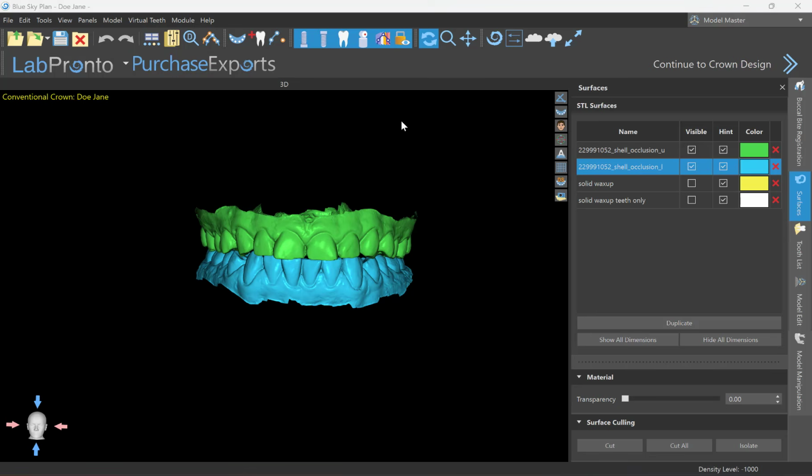Hey, this is Dr. Corey Glenn. I'm going to do a quick video today. This is on how to make a gingivectomy guide.